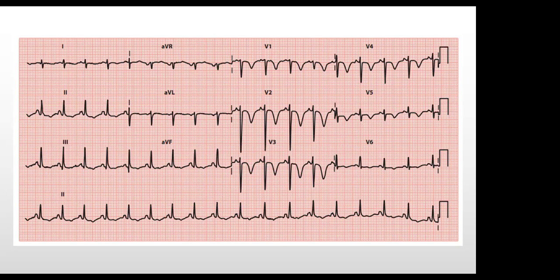It could be subarachnoid hemorrhage. Yes. Could be a patient with hypertensive cardiomegaly. So just keep the differential in mind. But remember that this is typical of Wellens, and Wellens is suggestive of involvement of the proximal LAD. Just keep that in mind.